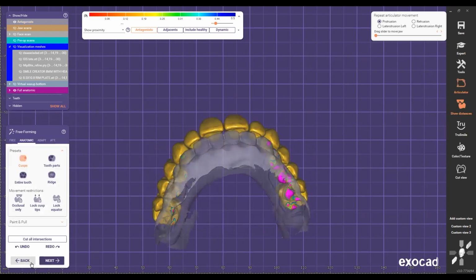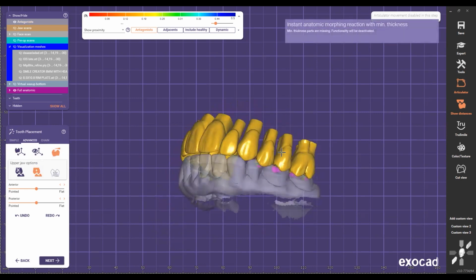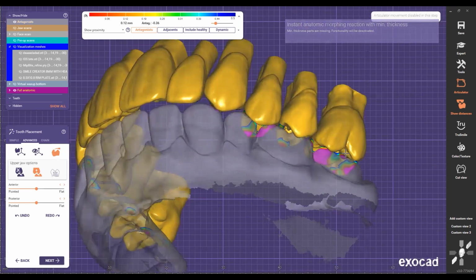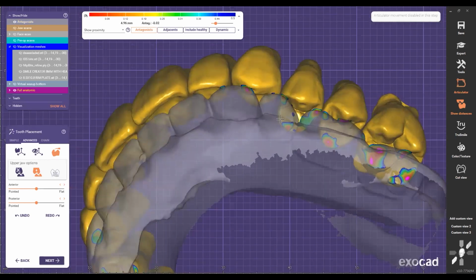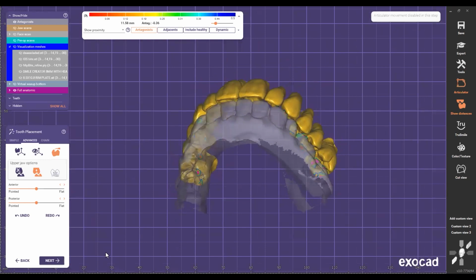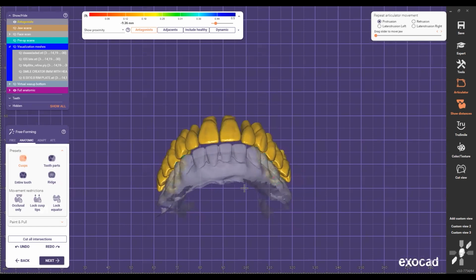In this case, I can just go back to fix this occlusion by going to the section advanced. Then I can start, for example, moving a little bit right there. I just want to make sure that this doesn't distort the tooth much, okay? So that way it's less for me to modify the occlusion, and it didn't distort my anatomy much. It's easy right away to get my occlusion properly. The occlusion is something you have to communicate with the doctor to see what type of occlusion they like, and then you do the same occlusion for the doctor.